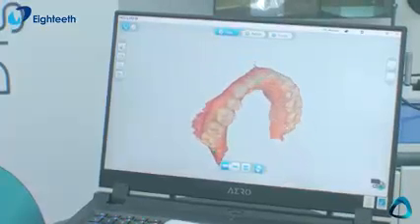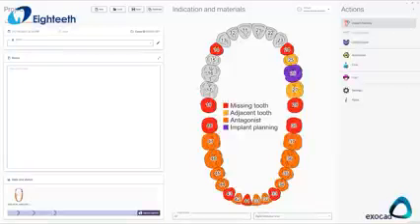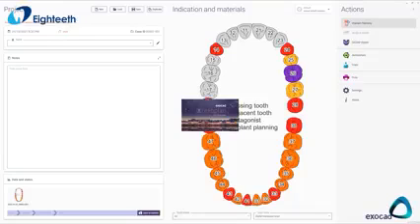Here we have some scans completed using the Helios 600. To plan an implant surgery digitally and fabricate a surgical guide, we use CAD software to combine CBCT data and intraoral scan data. First, you need to import all the data into your software of choice.